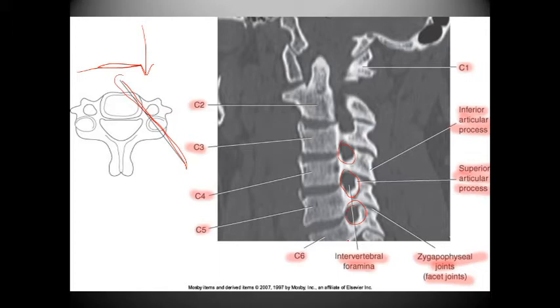And one thing I want to add is that on your best day of shooting an oblique cervical spine, you have probably never gotten your intervertebral foramina to look like this. You've never seen them in this kind of definition. That's why CT has taken the wind out of the sails of traditional conventional radiography in terms of cervical imaging, because we can see all of this in a higher degree of detail and probably do it at the same rate that we could get all these pictures shot for the cervical spine.